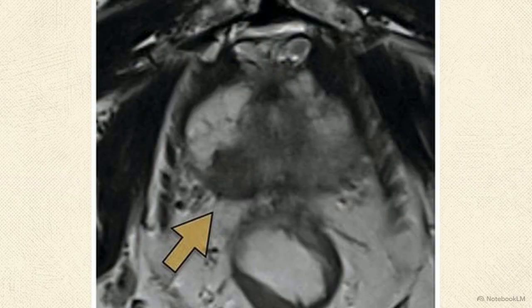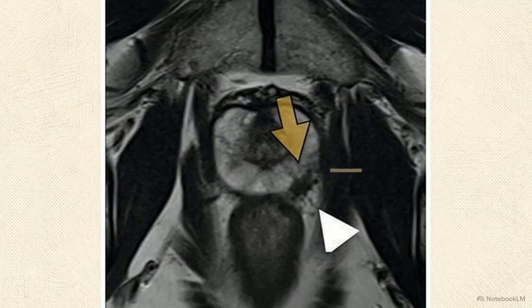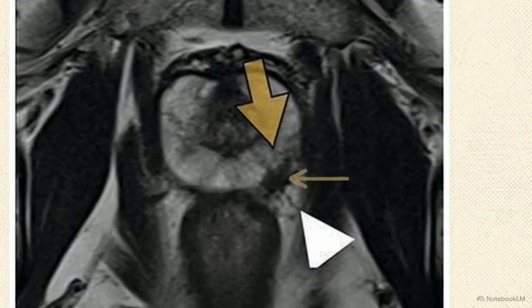On this scan, the risk increases. The lesion now broadly contacts the glandular margin, exerting outward pressure to create a smooth capsular bulge. In this slice, the indicators become high risk. The boundary loses its clear definition. The irregular bulging and spiculation seen along this margin suggests the tumor is infiltrating the surrounding connective tissue.